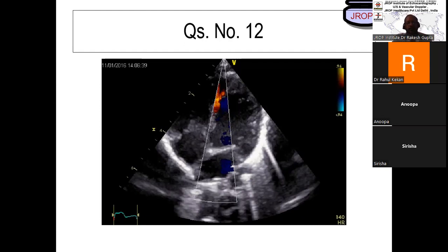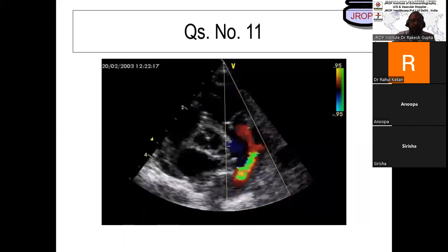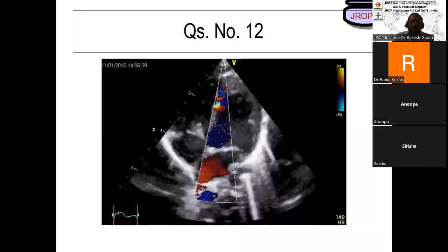Inlet? Why inlet? Why not outlet? Sir, the aorta is not seen. Great, that's a good point. So one is VSD, second is inlet VSD. What kind of septum is it? Mid, apical or basal? It's mid. Mid-muscular inlet VSD. That's all, sir. Okay, sir.